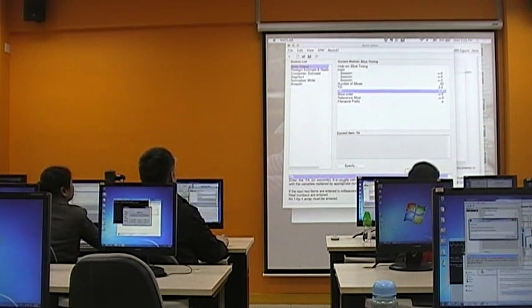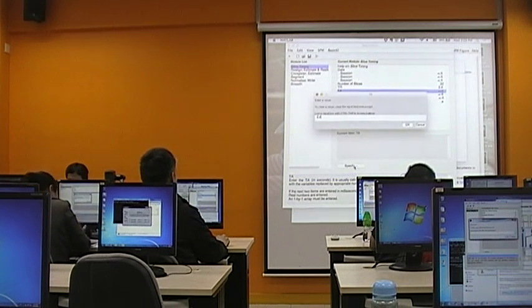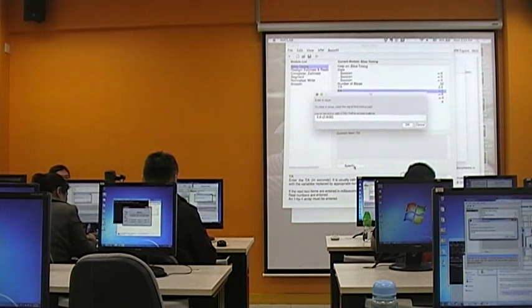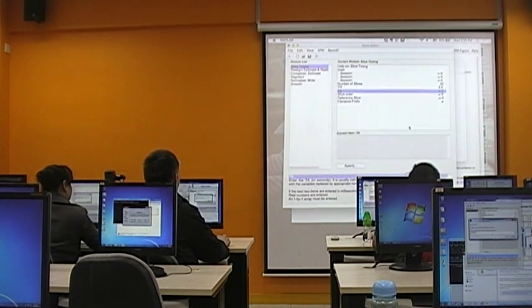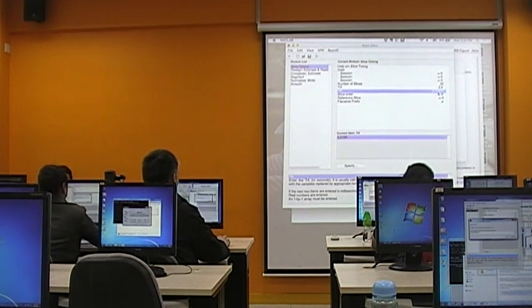And here at the bottom, there's already an equation for you to calculate this TA value. It's usually calculated as TR minus TR divided by the number of slices. So you can just put in TR minus TR divided by the number of slices, because this is a MATLAB environment. You can put any kind of equation in this space, as long as you get an answer. Then you see that TA automatically equals 2.5 something.